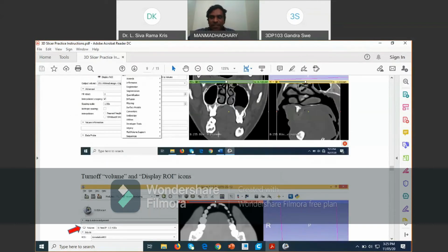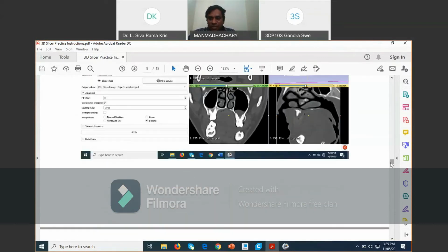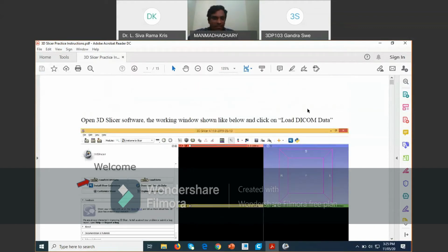Now we can go for the practice session. So all of you, please be ready with the practice session. Open your laptops, all of you. I request all the participants now. We are going to start again from the beginning. Open your laptop, open the 3D Slicer software and follow the step-by-step procedure. If you have any doubt, please post it immediately in the chat box.